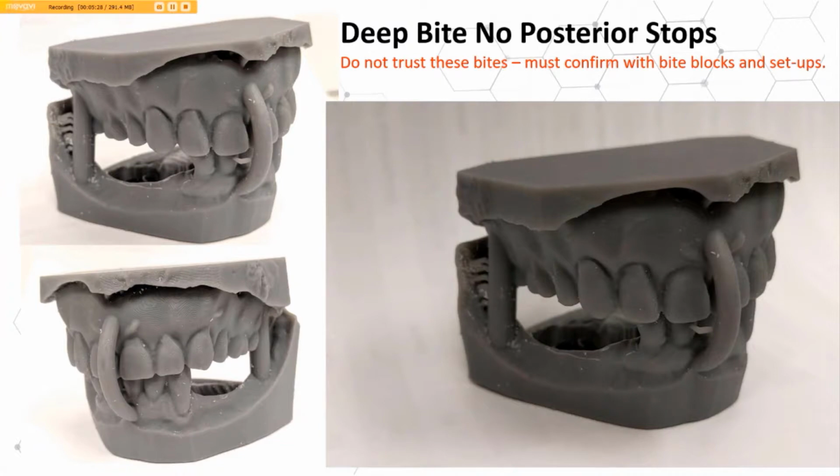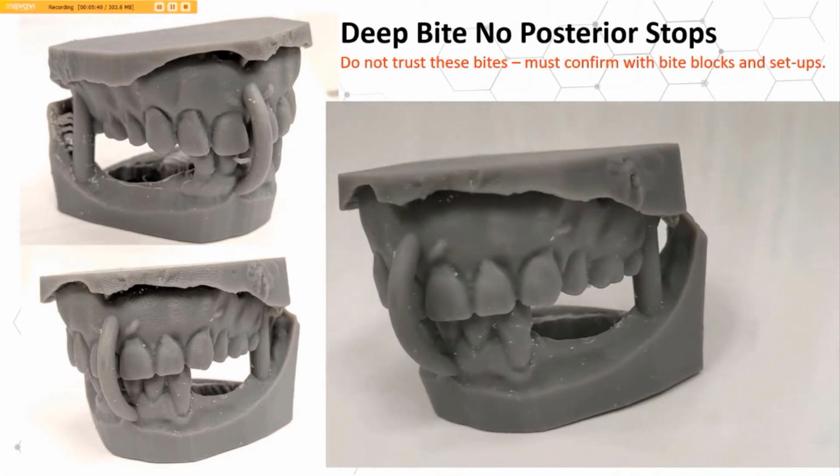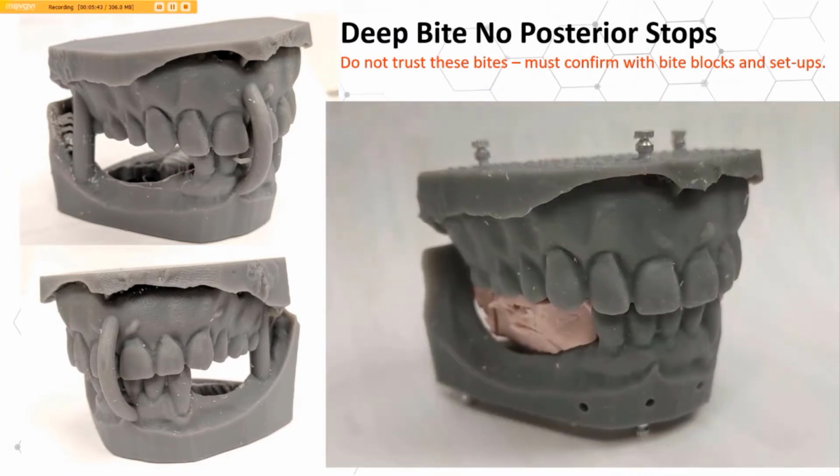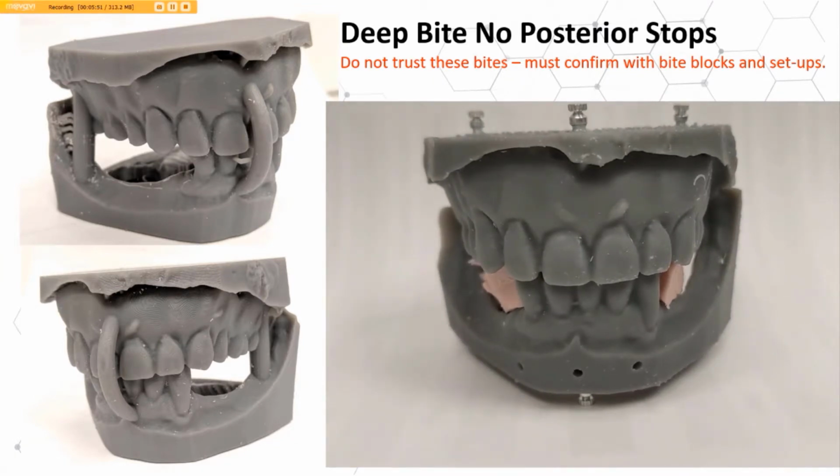Let's go through a few challenging dentate cases and the records that we request in these situations. Many of these cases, most of these cases, involve pathology, involve perio issues, involve patients who have been missing teeth for years, and many patients who do not exhibit a well-established bite. Many cases simply have 4, 5, maybe 6 teeth in the anterior with no vertical stops. In these cases, we request that a bite block be used and a setup, and often that be processed into a scan appliance, and then a dual scan be captured, which we'll talk about in the upcoming slides. But as we see here in the red, we do not trust these bites.